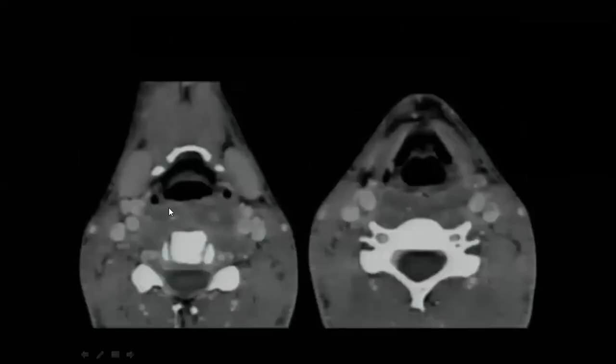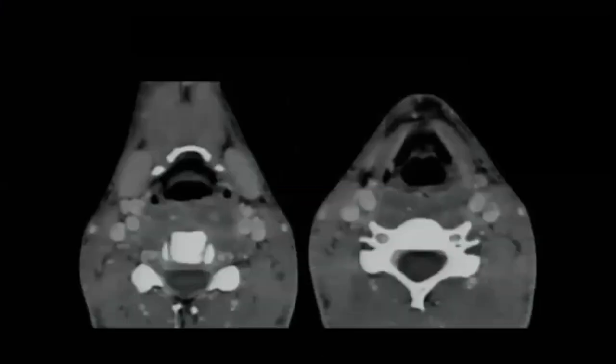The perivertebral space, which is a very critical space, and we like it in the emergency. If you suspect that it could be infection, this infection can extend up and down, even reaching the mediastinum. So you should be careful, because you can reach a very low level or a very high level since you have an open space all the way down. So this is diskitis with prevertebral abscess.